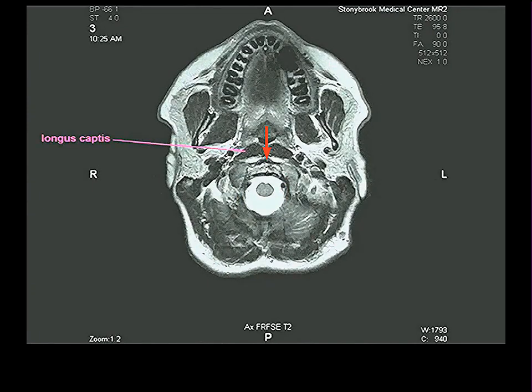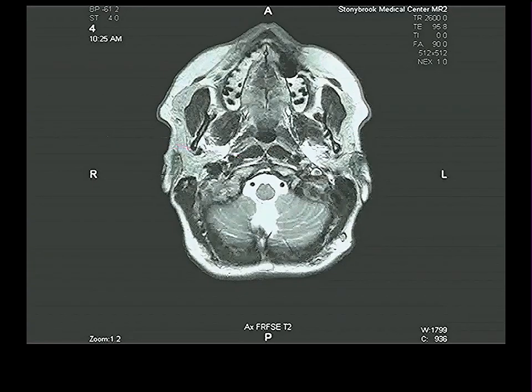The question is, what's this? Why am I sitting here trying to figure out what this is? Because you have these two neck muscles, longus capitis and longus colli. The longus colli ends on the anterior tubercle of the arch of the atlas. So if it extends beyond that anterior tubercle, it's longus capitis. This is not ending there. This is going to continue superiorly to it, so therefore it must be longus capitis, because longus colli ends at the anterior tubercle of the arch of the atlas.